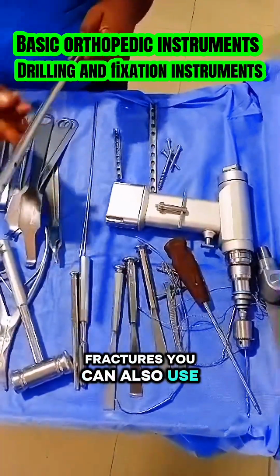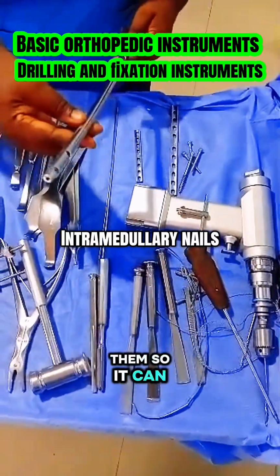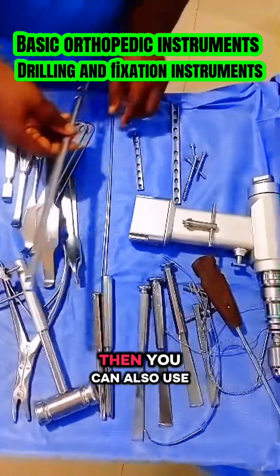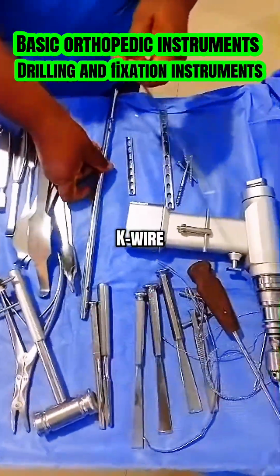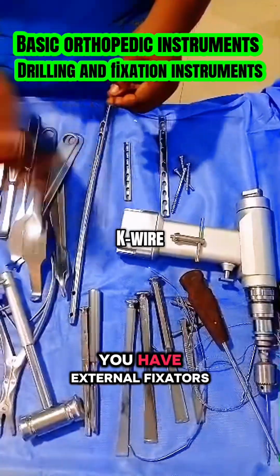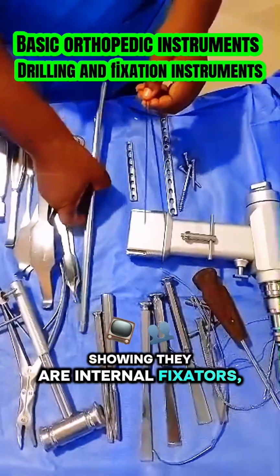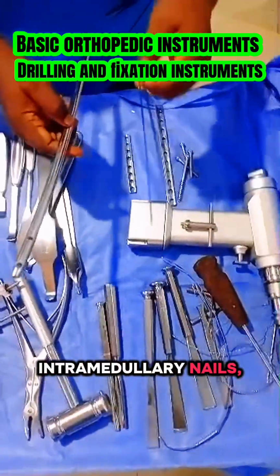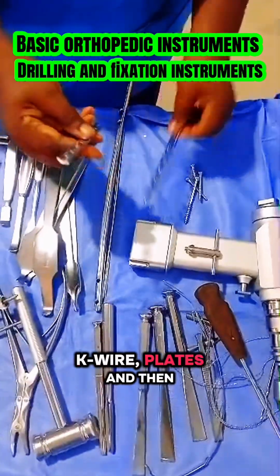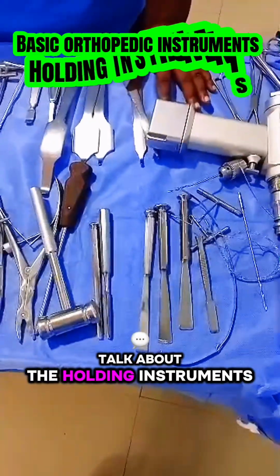You can also use intramedullary nails. This is one of them. So it can be used to fix the bone. Then you can also use K-wire. This is an example of K-wire. So they are used to fix the bone. You have external fixators, but these ones I'm showing are internal fixators: intramedullary nails, K-wire, plates, and then the screws. Then we'll talk about the holding instruments.